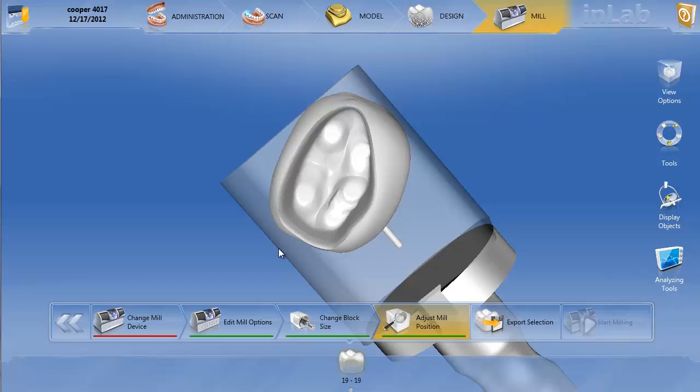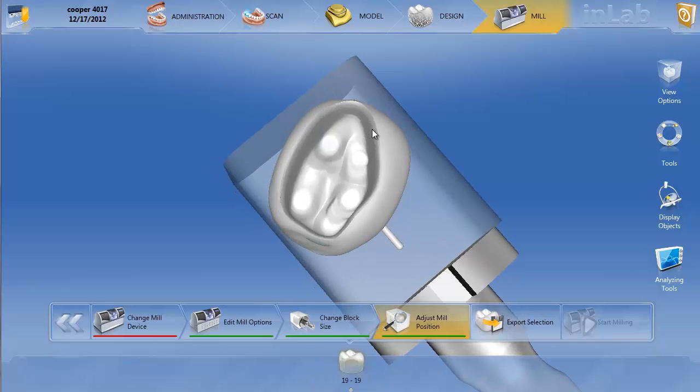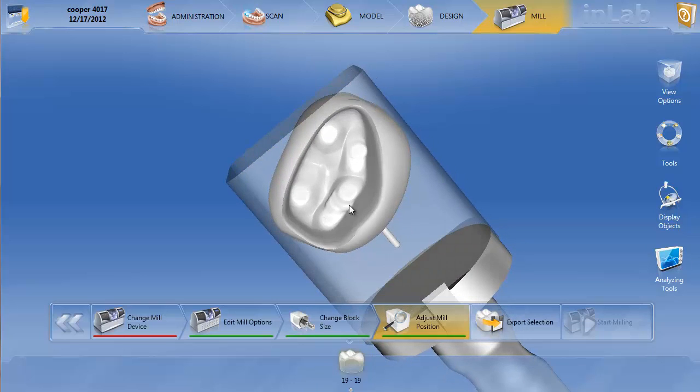In those cases, you're going to have to go ahead and just rescan the abutment in the mouth and make a crown the traditional way. So hopefully that helps you get by this potential bug. The best thing is before you actually send that abutment to the lab, or before, if you have an in-office lab, before you go ahead and send that, make sure that you've got a good split and make sure your abutment crown is split correctly.